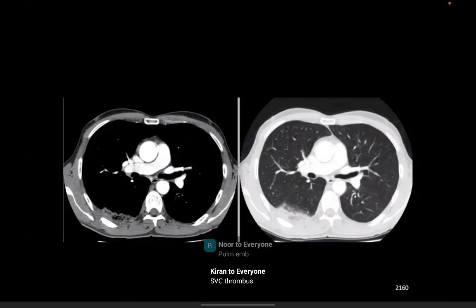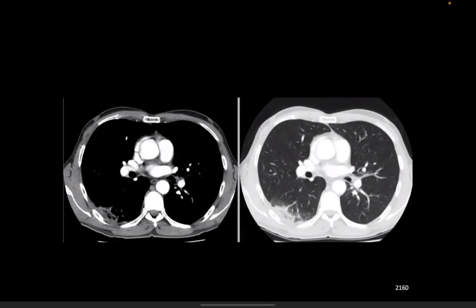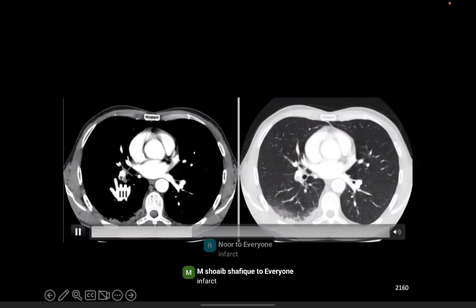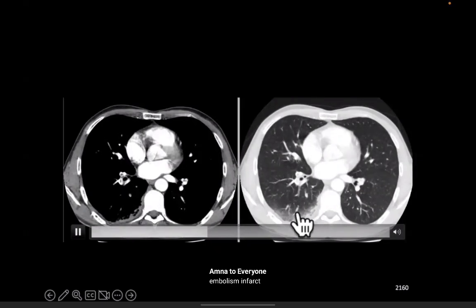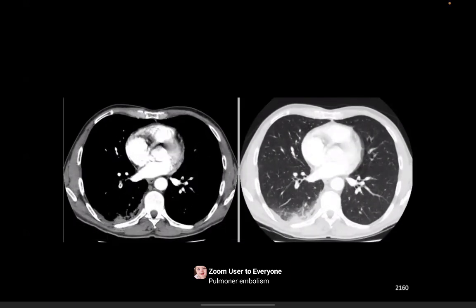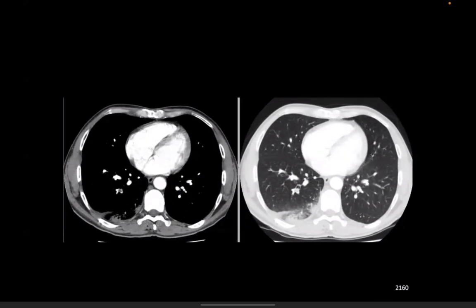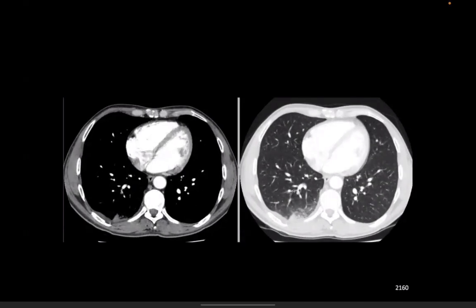Yeah, they've got a pulmonary embolus, and in the posterior right lower lobe, there is a pulmonary infarct. So here is the pulmonary embolus in the right lower lobe pulmonary artery, and then we've got the pulmonary infarct here. So these patients not only will have all the signs and symptoms of a pulmonary embolism, but they will also have hemoptysis by virtue of the fact the patient's got a pulmonary infarct. Just here.